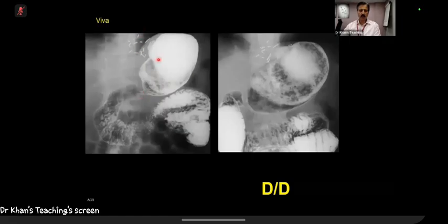These surgical clips, in that era when they used to do these kinds of surgeries, they used to do what we call partial or selective vagotomy. So the vagus nerve or its branches were also cut. So this is that evidence. With that, you can see this mass. This mass has got a mottled, bubbly appearance. The key thing is it's mobile.